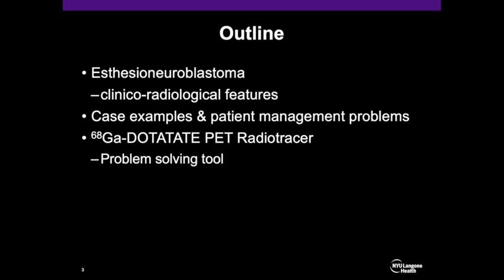Esthesioneuroblastoma has multiple clinical and radiological features that we can talk about, but I will emphasize the most common ones. We will discuss a few case examples and identify patient management problems, and the gallium dotatate PET radiotracer. We will discuss what it looks like and how it can be used as a problem-solving tool.